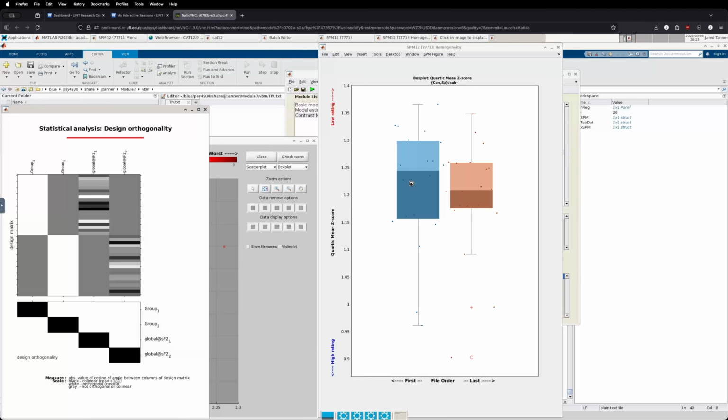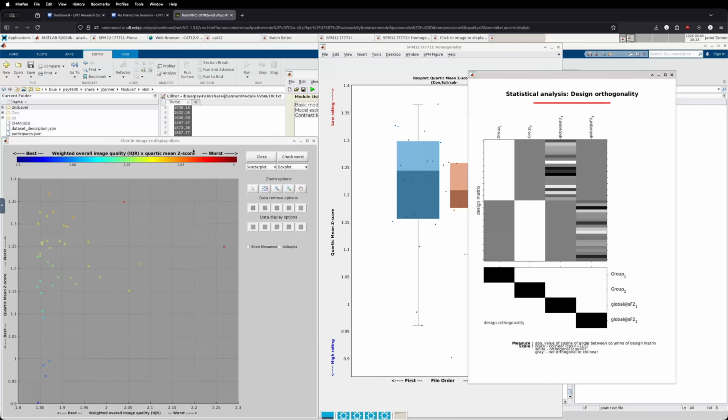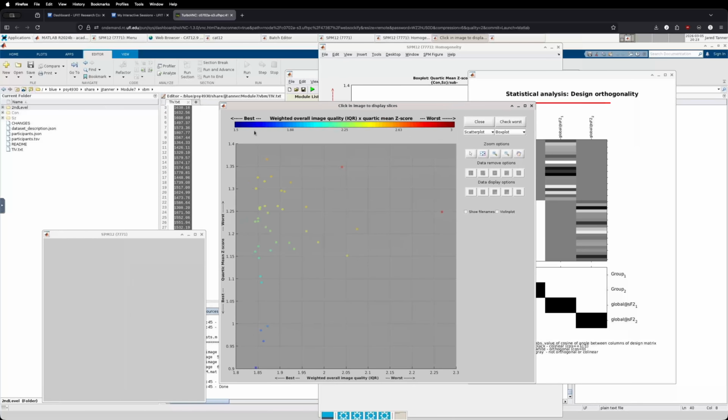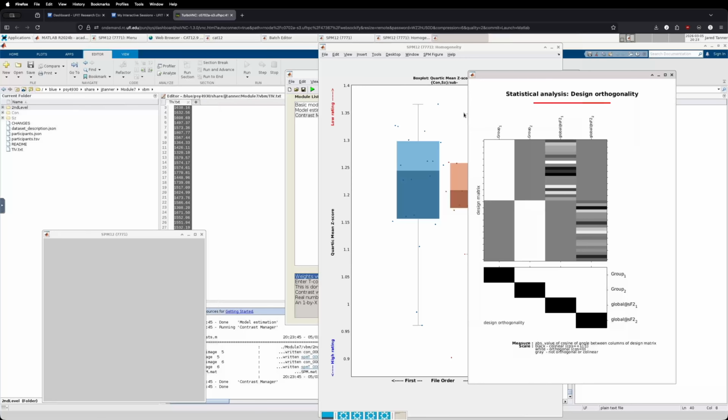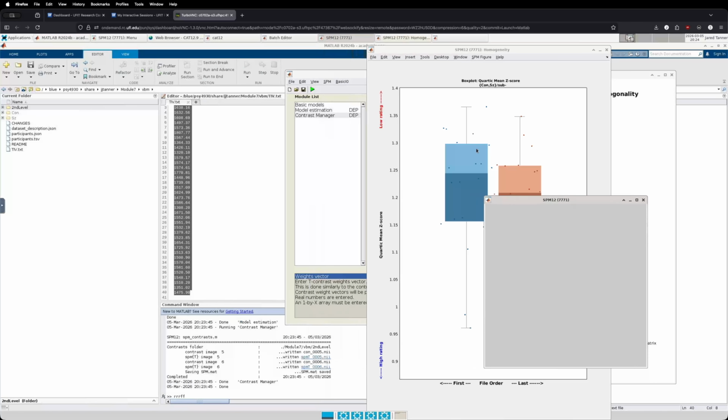And we can see we still have a little spinning cursor, so we're just going to wait a little bit for this to finish up. But there's different windows again we can look at, but we really don't have to wait for very long because now it's ready to go. So I can leave these all up, or we can close them. I'm just going to close this window, kind of get that out of the way, but it doesn't really matter. These can just kind of be there.